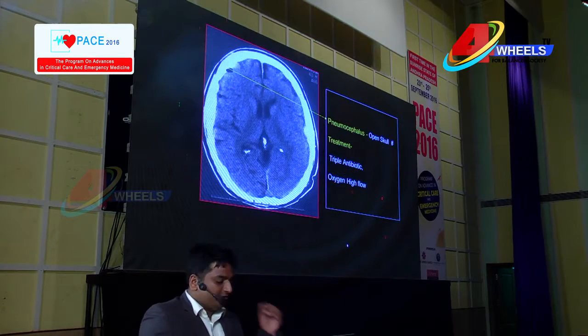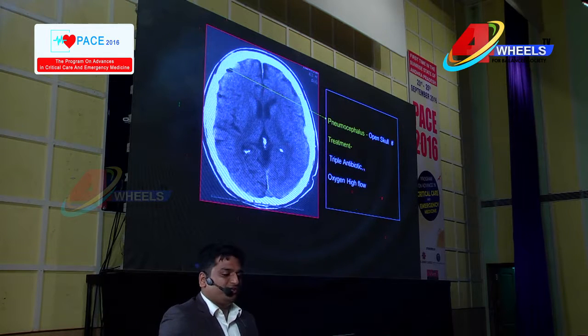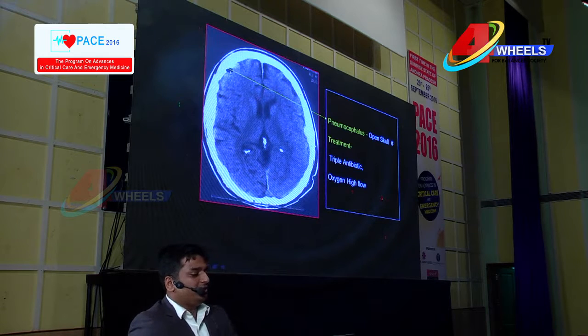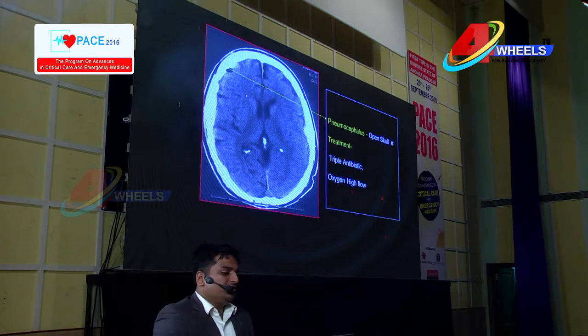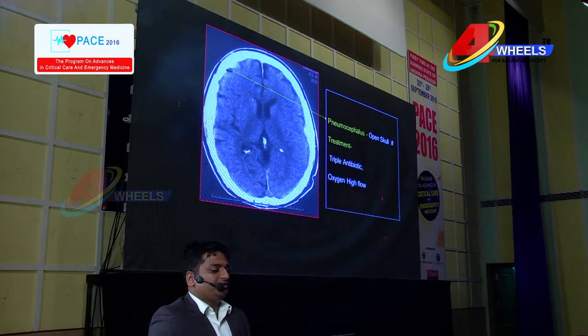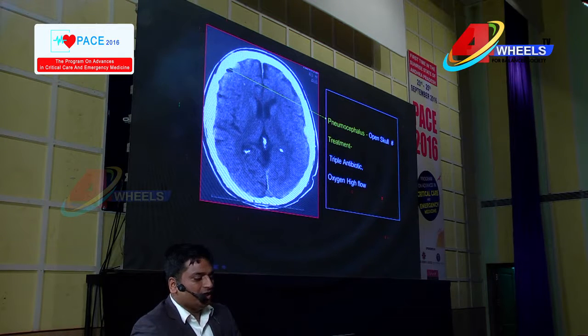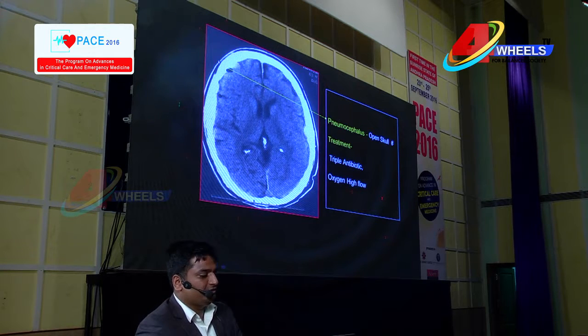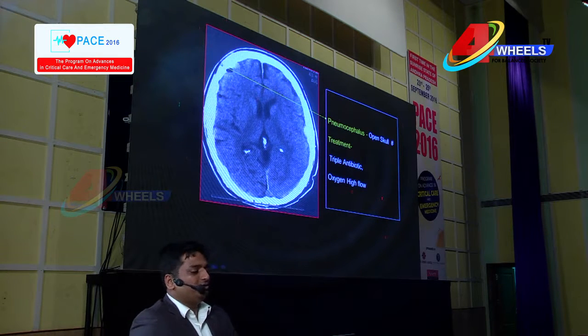When you comment on fractures, you need to look at pneumocephalus, which is air pockets within the parenchyma. So this is your air which is pitch black. You can see this is your CSF, whereas air is very pitch black. When you see pneumocephalus, that indicates there is some crack which is leaking into the environment. That indicates there is an open skull fracture.